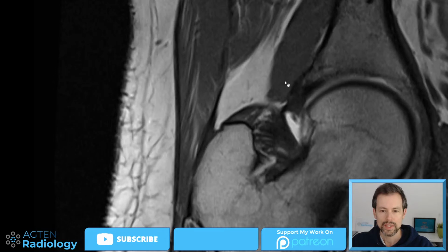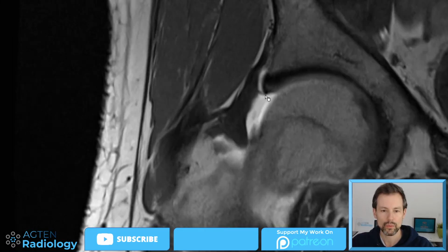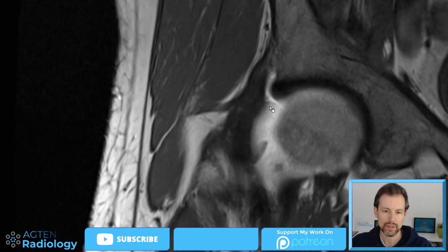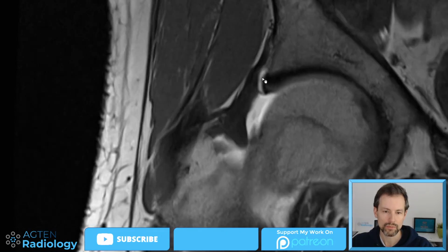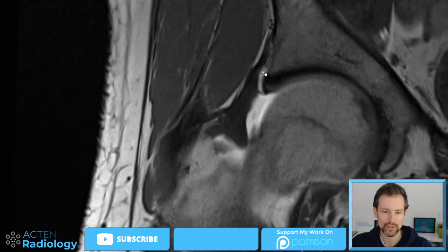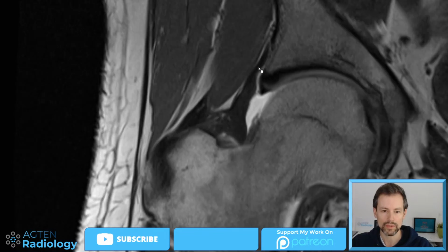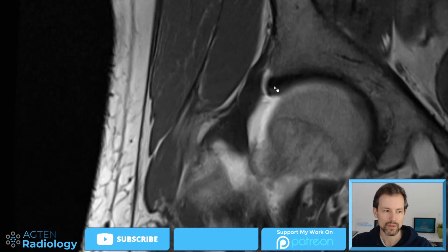So this is now the preoperative scan, and we can see already here we still have, this is an arthrogram, fluid running up here into the perilabral sulcus. So this is very normal. This sulcus can have different dimensions. It's most prominent in the most superior portions, but basically it goes all around. And after surgery, most often in nearly 100% of cases, this will be obliterated. So we will try to see whether we can see this on the post-operative scan.